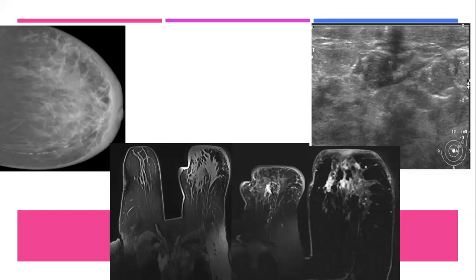Excellent. Well done. There is vascular calcification, no evidence of suspicious calcification. Excellent. If I proceed to the ultrasound, it's shown here.